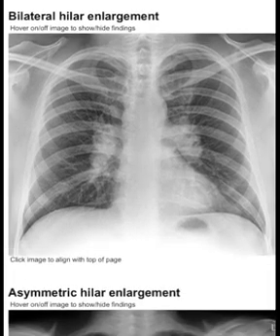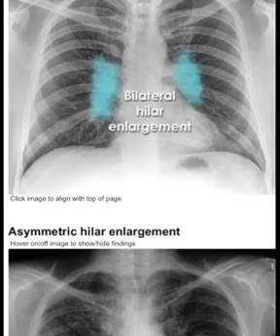Bilateral hilar enlargement. Both hilar are larger and denser than normal. Clinically patient presents with joint pain, erythema nodosum. So this diagnosis is sarcoidosis. What are the differential? Lymphoma, metastatic disease, or infection may occasionally look similar. Pulmonary arterial hypertension may also cause bilateral symmetrical hilar enlargement.